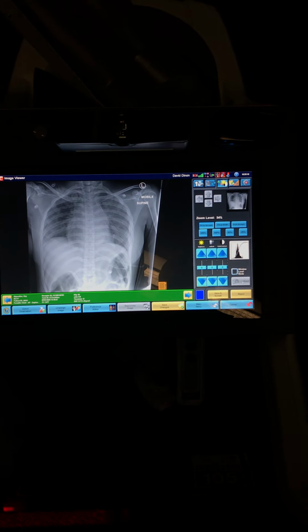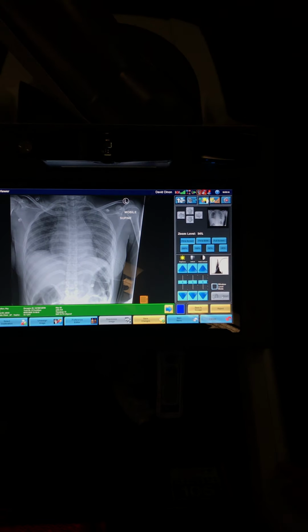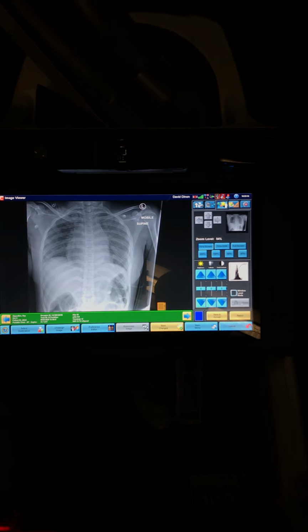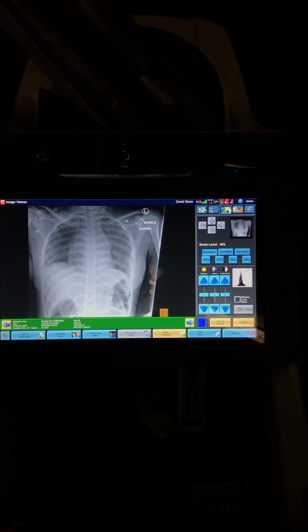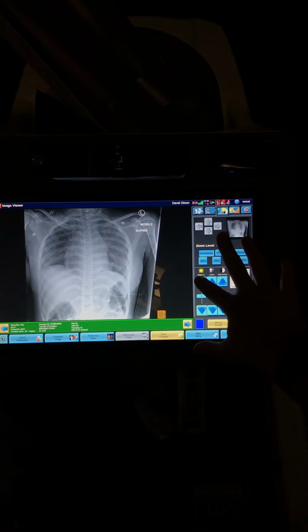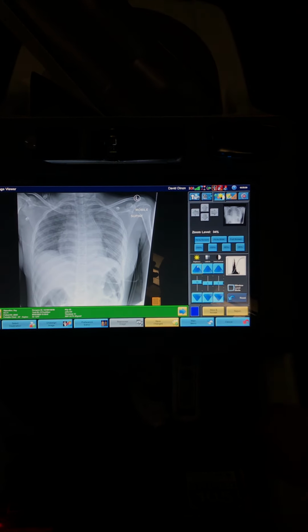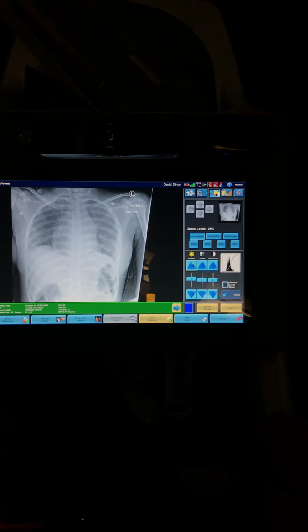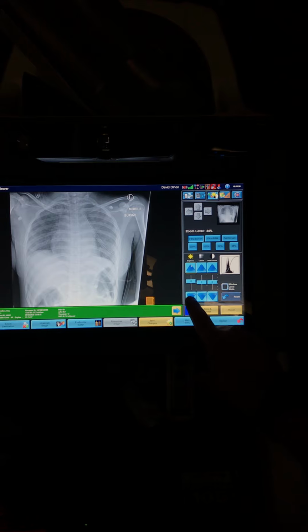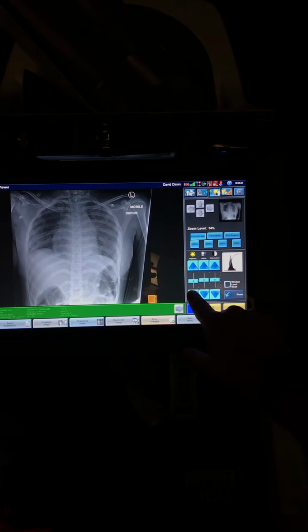Here's Ray Skywalker's image. We're just going to play with the brightness, latitude and detail contrast sliders here, and they will affect the curve applying to the histogram in the lower right hand portion of the screen. If I increase the brightness value, the image becomes whiter, more shades of white, brighter in display. Likewise, if I decrease brightness, it becomes darker overall beyond 0.